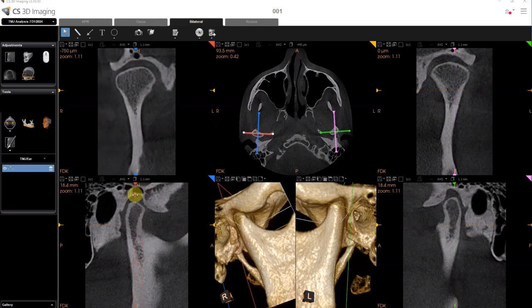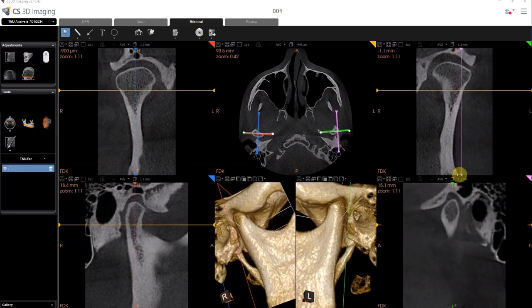If you want to slow down and take a closer look and do a fine tune on the area you're looking at, put your cursor on the view and then use your scroll wheel on your mouse. These same functions work for all of these 4 views. So for the blue, we're going to look for the blue handle. For the upper right view, we're going to look for green. And for the pink view, which is the lower right.